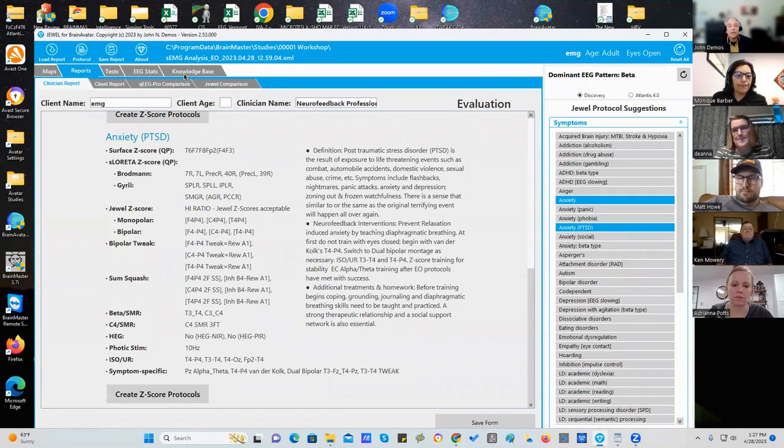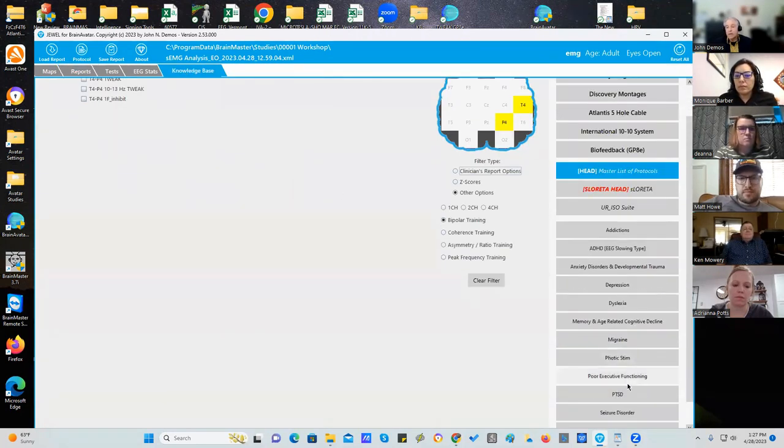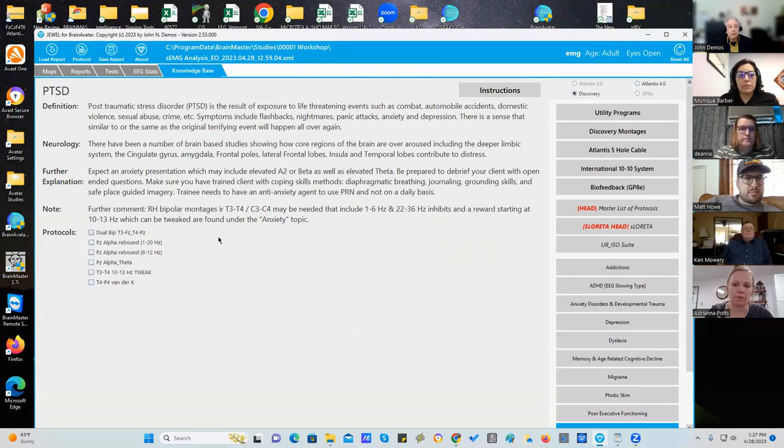So one of the things I did in the knowledge base that's a little bit helpful is I have a tab that says PTSD. And now notice in this one, I have the alpha rebound. So Sieber and Fisher and some others have worked to develop this. And here is some suggestions on training PTSD.